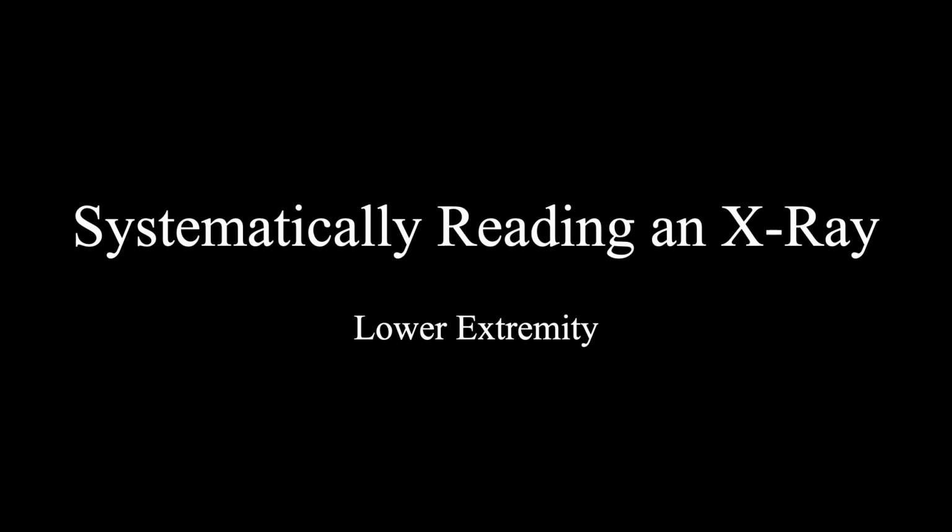All right. This is a very, very brief overview. You can pause, replay, go back. I really recommend downloading the Sublux app. It makes reading x-rays much simpler, and they go over the same systematic approach. That's how I learned how to read an x-ray. So using that app really does help.